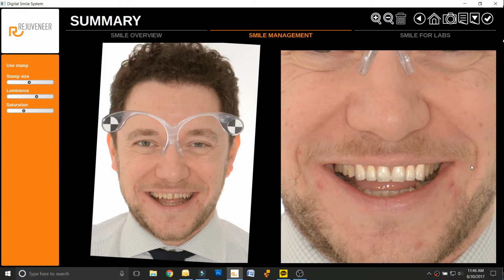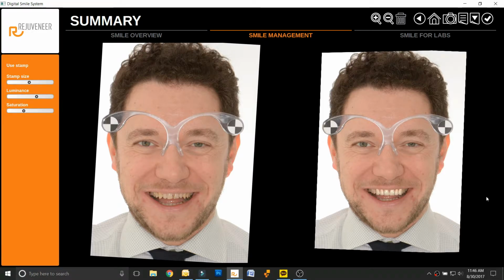Congratulations! You have just completed your first Rejuveneer Smile design.